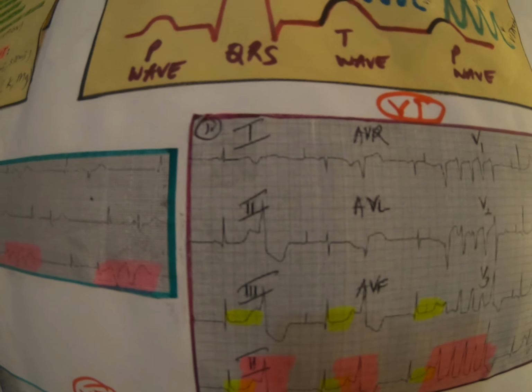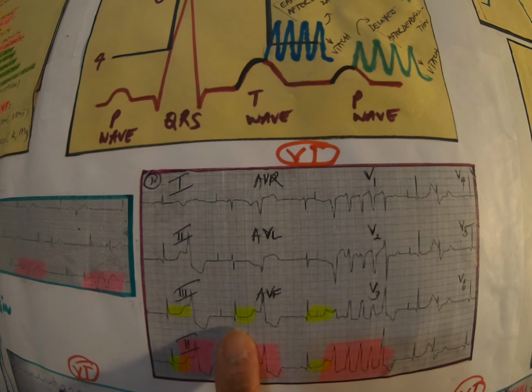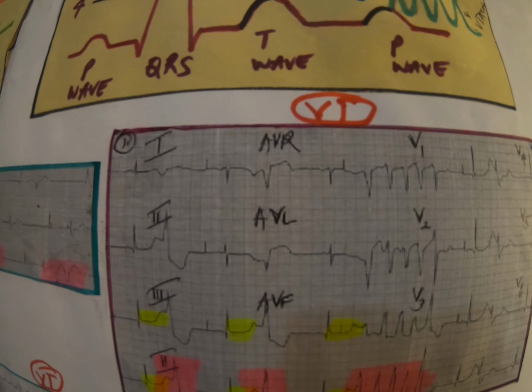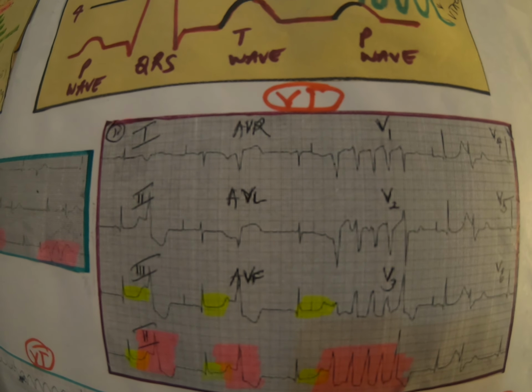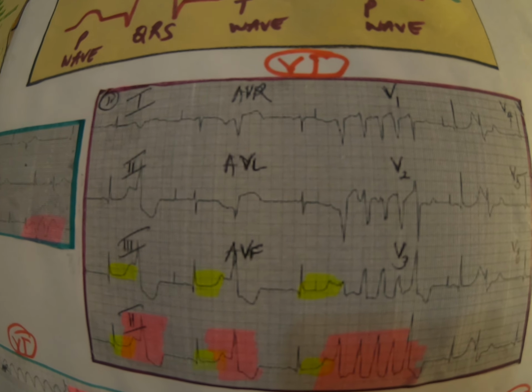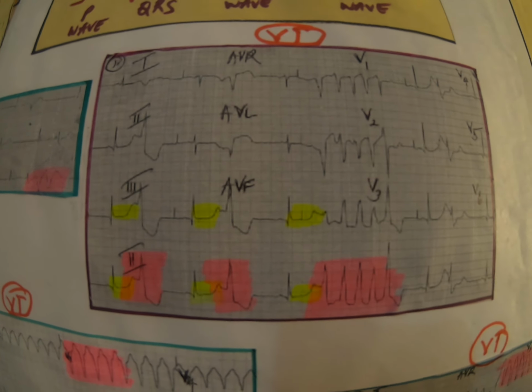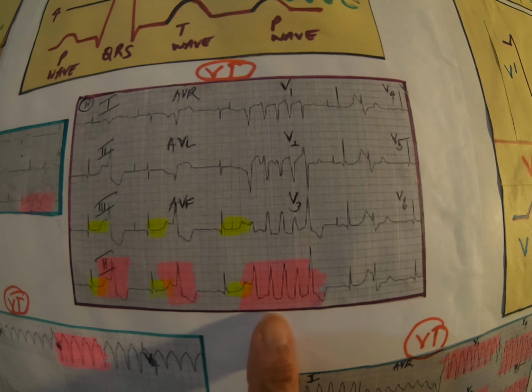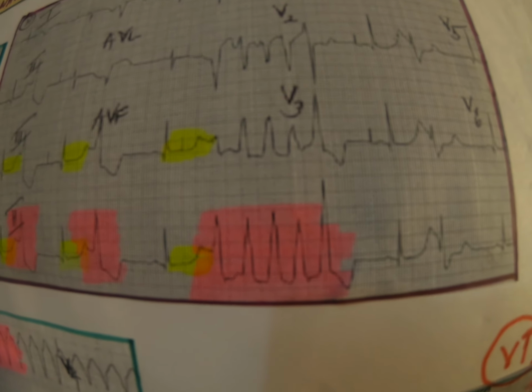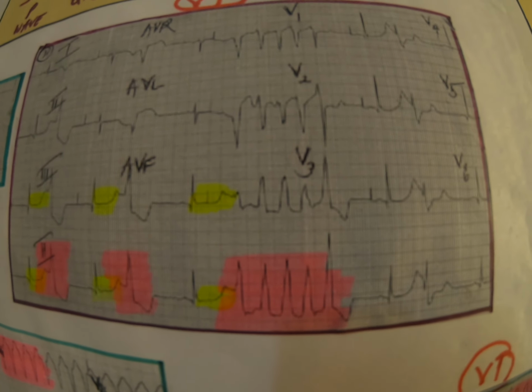Okay, next one here, the same. There's another one here. We got bigeminy here, ventricular. So you got a sinus rhythm here, and you got bigeminy. If they keep having bigeminy there, is your patient ischemic, having chest pain, wet, hypokalemic, hypomagnesemic, or on amiodarone, QTC prolongation, all these things? Start checking. Okay, there we go. Then if that ventricular bigeminy starts creating this, it is polymorphic VTAC, a short run of polymorphic VTAC. The QRSs are not uniform, then you're close to having long runs. Next one, you see that will be a long run VTAC. Start alerting yourself, do something.